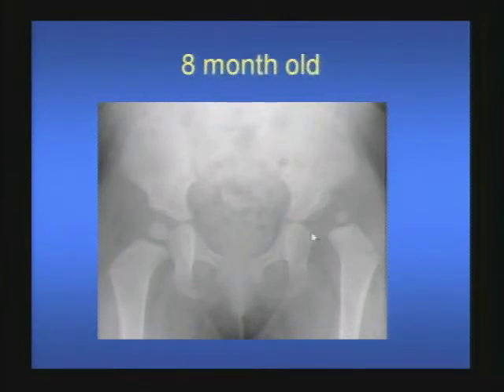You can see in an 8-month-old a subluxated left hip joint, which is laterally and superiorly displaced with respect to the acetabulum. The acetabular roof is steeper on the left side as compared to the right side, and there is asymmetric shape and mineralization of the femoral capital epiphysis. Few of the lines that are useful: the perpendicular line or Perkins line, which is a line tangential to the outer margin of the acetabulum, normally intersects the proximal femoral metaphysis in the inner or the middle 1/3. You can see it completely misses the metaphysis on the opposite side.